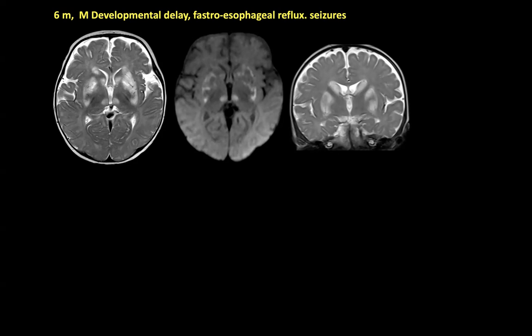Again, you can suggest the gene, especially if you have the benefit of the clinical scenario. Of course, everybody knows that bilateral symmetrical abnormalities in the basal ganglia, most often sparing or involving less the globus pallidus, but there are exceptions to that, like for instance, Kearns-Sayre disease. But this kind of pattern is typical of mitochondrial cytopathy. So you see it like that, you call it Leigh syndrome and you think mitochondria.